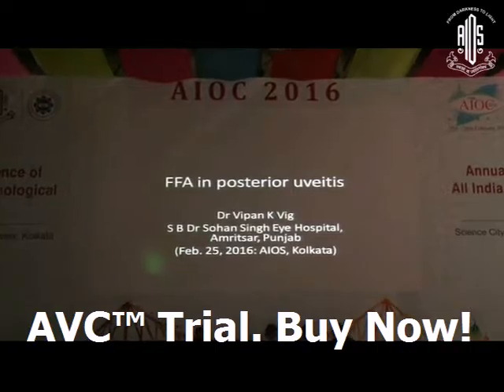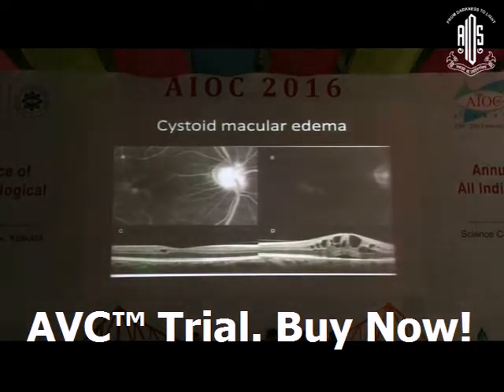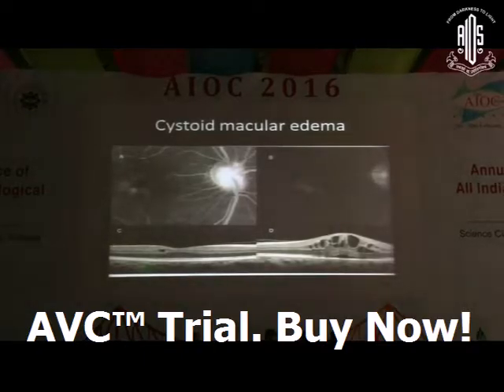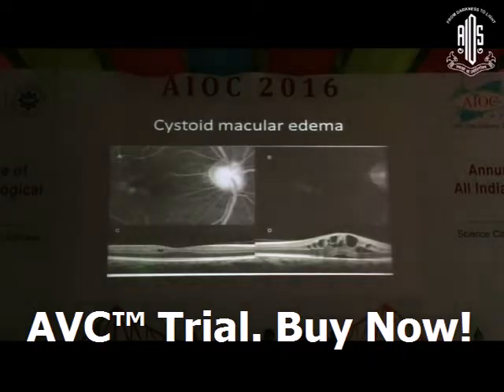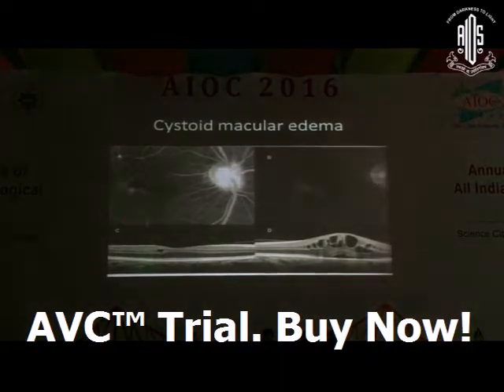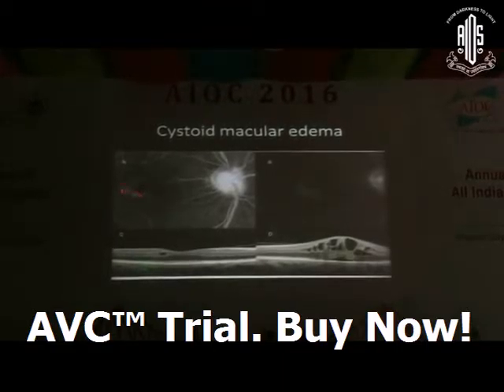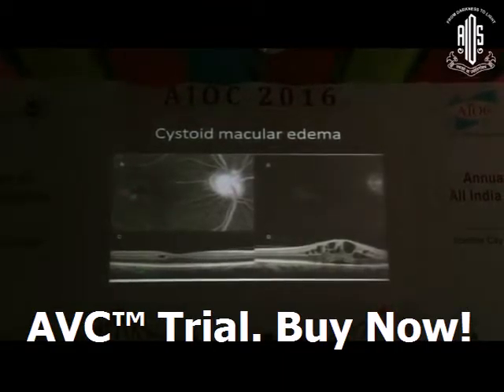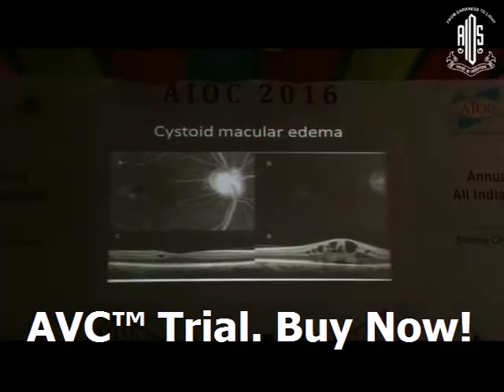So my topic is FFA in posterior uveitis. Basically, inflammation is a very common denominator in the formation of cystoid macular edema. Before I go on to the conditions, I'll first show a picture of cystoid macular edema. There is a collection of the dye here in the macular region in the form of petaloid spaces, and the disc is also hyperfluorescent in many of the inflammatory conditions as well as in surgical edema.